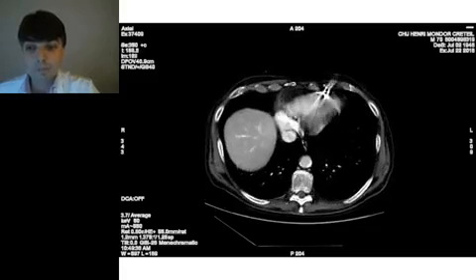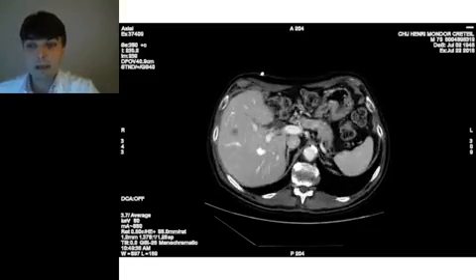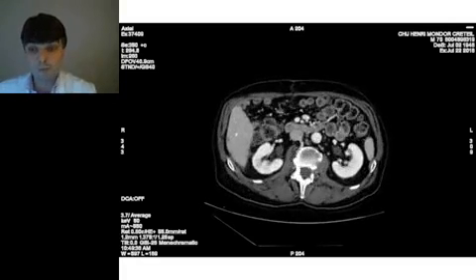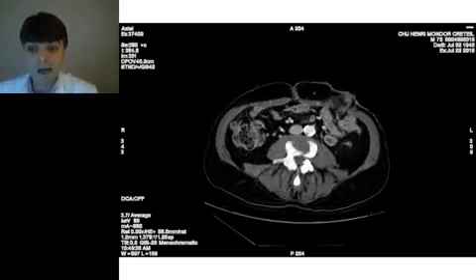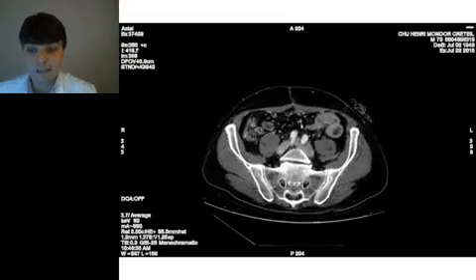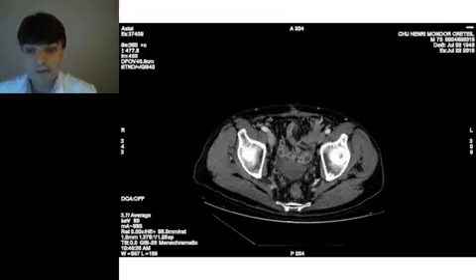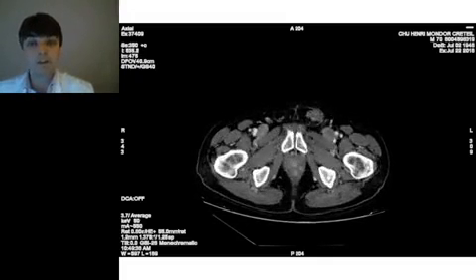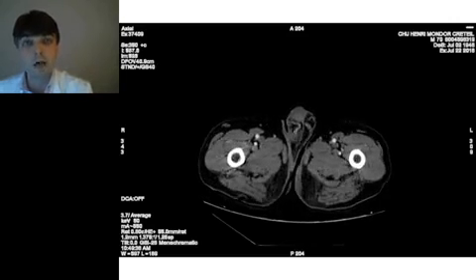Again, thorax, abdomen, pelvis, optimize contrast within the vessels now with low keV levels. Now look at the way the aorta sticks out here as compared to the 100 keV level that we just saw a few minutes before. And of course, you're going to see in the liver optimized detection of the hypovascular lesions, because the liver enhances so much better. You can see the lesions sticking out, and even a very small lesion here, close to segment 5 and segment 6, subcentimetric, subcapsular lesions, those lesions which are difficult to see, well, you can see them because there's improved contrast.